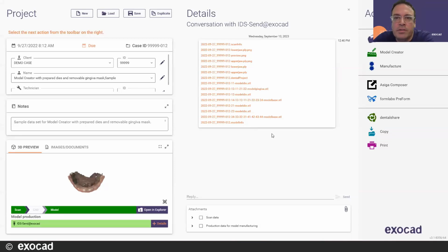So if you haven't updated to DentalCAD Rijeka yet, as you can see, there's a lot of cool features and just time-saving stuff, and we try to make it more flexible and easier to use and be able to do more cases in the software.